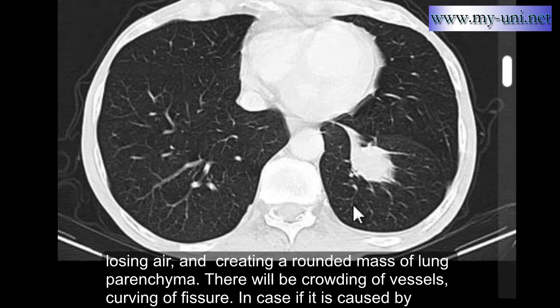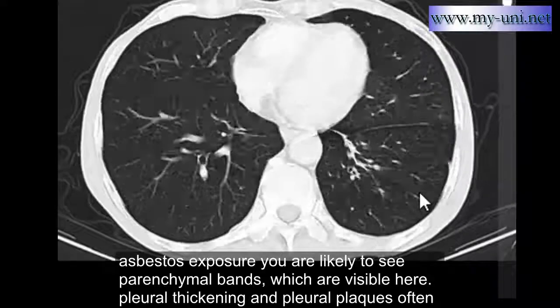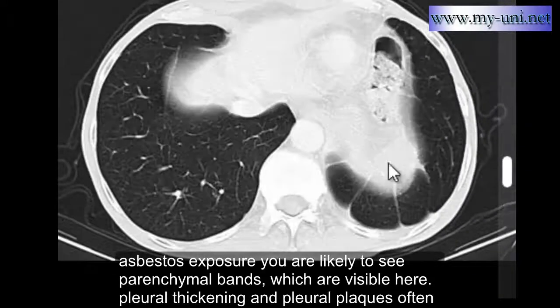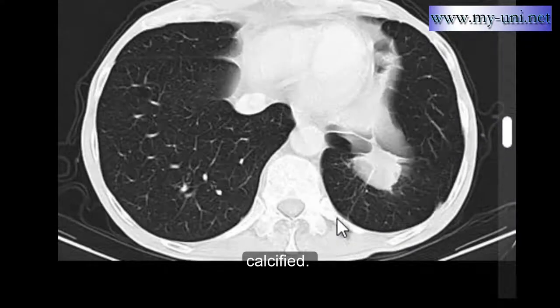There will be crowding of vessels, curving of fissure. In case it is caused by asbestos exposure, you are likely to see parenchymal bands, which are visible here. These are parenchymal bands. Pleural thickening and pleural plaques are often present, and plaques are often calcified.